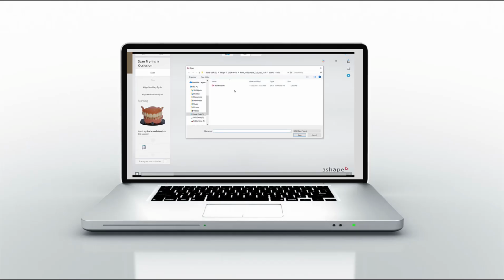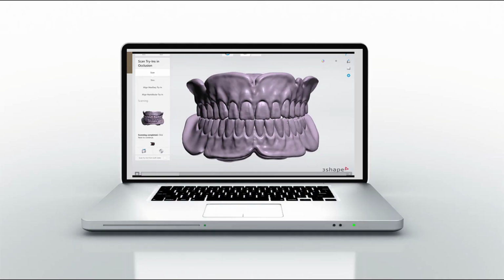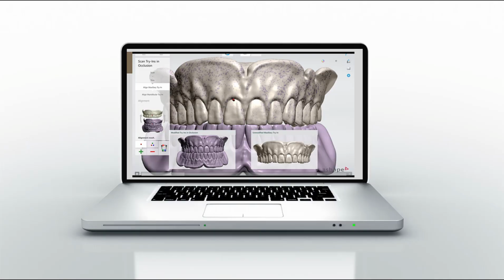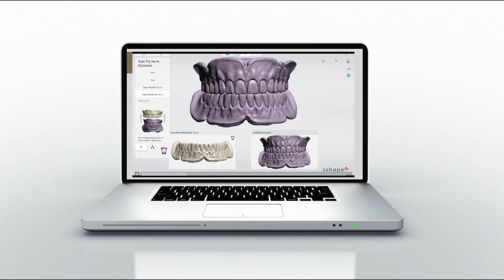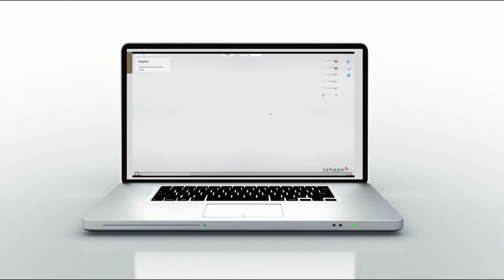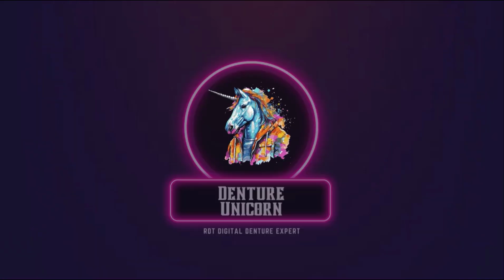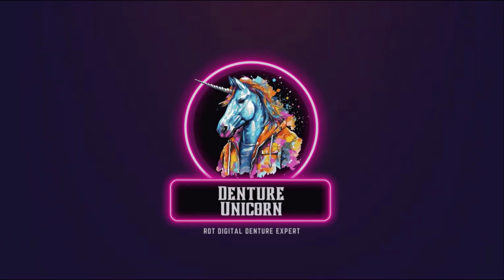This is a presentation that I gave all across Canada last year, and my wonderful fans have requested a recording of it many times, so I'm finally sitting down to do a recording and walking through it at a nice slow pace. There is a section of the video that is strictly just the copy reuse CAD, and you can skip ahead using the clips labeled in the video.